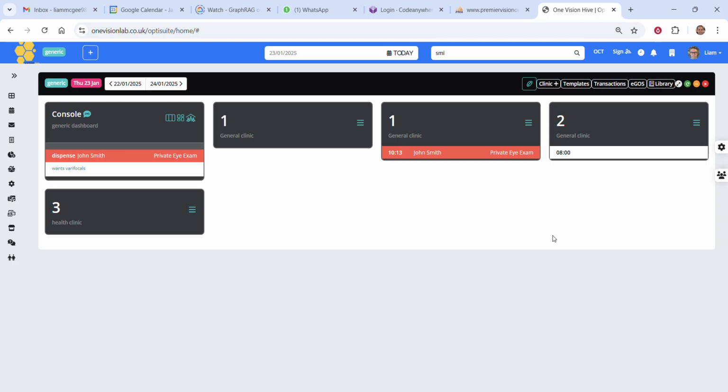So hopefully that gives you a nice overview of the basics of the system. You can log in, you can create a prescription, you know your way around the record, and you can do most things. Each module then has its own tutorial giving you more information.